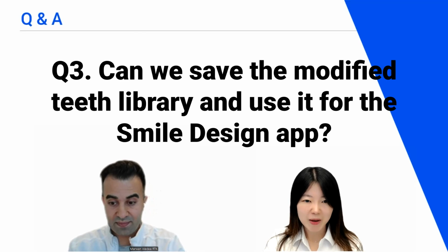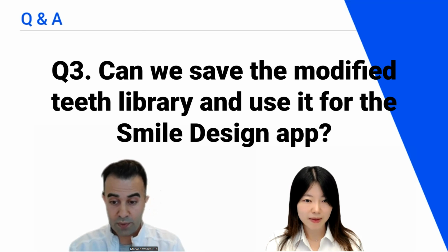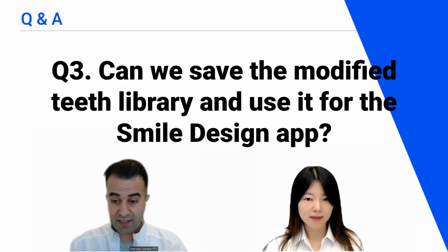Okay, last one, question number 3. Can we save the modified teeth library and use it for the Smile Design app? Yes. Once we obtain the 3D teeth library, you can see it's time consuming, however we're going to do it only once. Then we can export it to the Medit Link and keep it there. As I demonstrated today, I named the file teeth library, as a patient under the Medit Link.